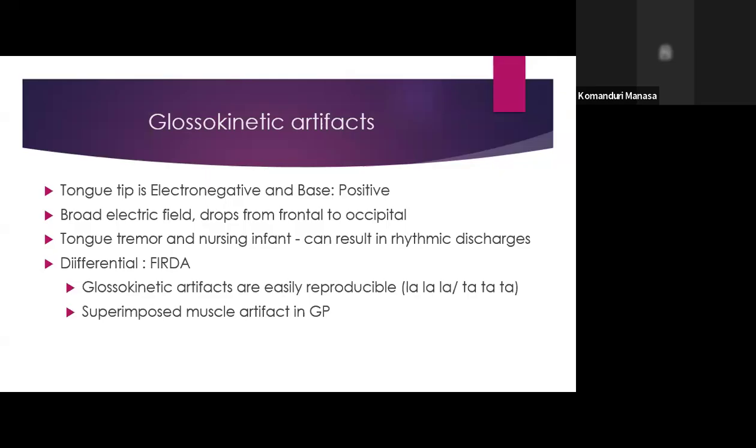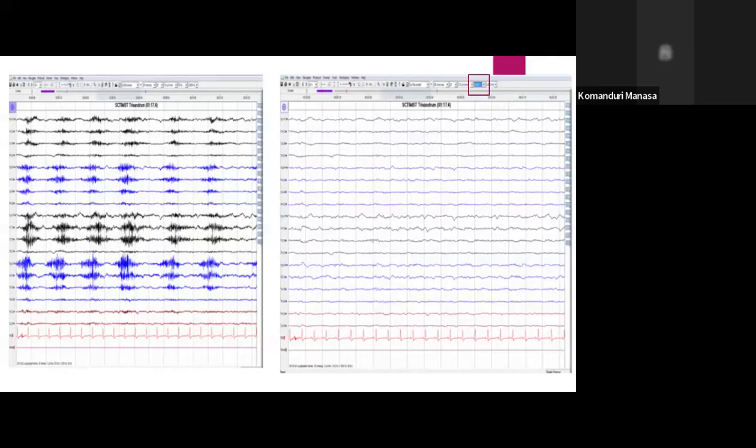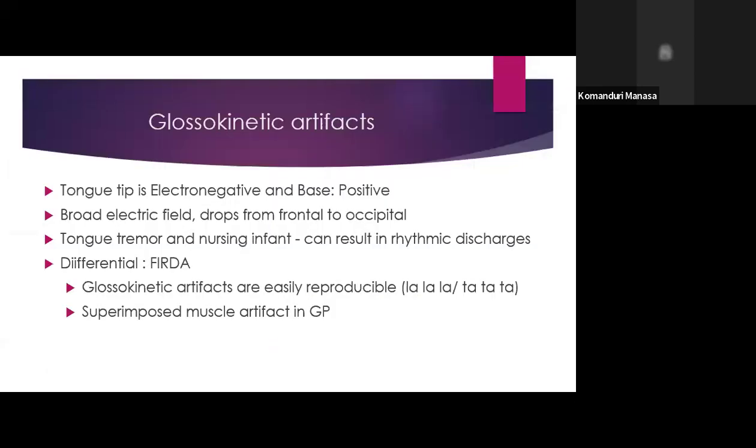It can alter the EEG, aliasing of the signals. So keep the anti-aliasing filter on. We usually do not reduce the high frequency filter because it is an anti-aliasing filter, which, if we reduce it, most of the required physiological potentials which we want to see on EEG can be filtered out. So we don't use that.